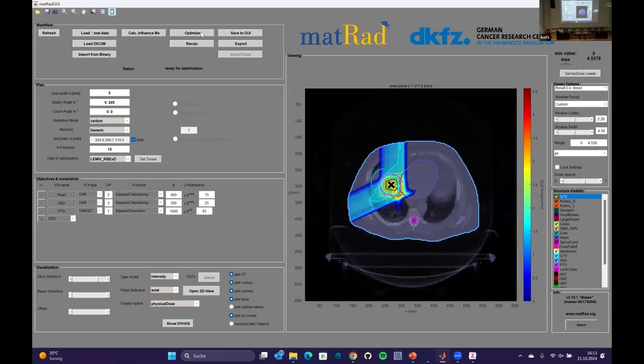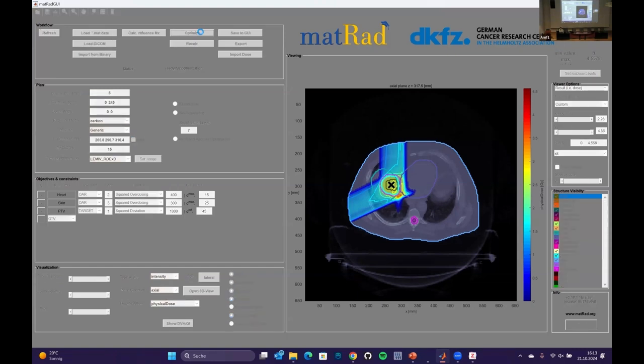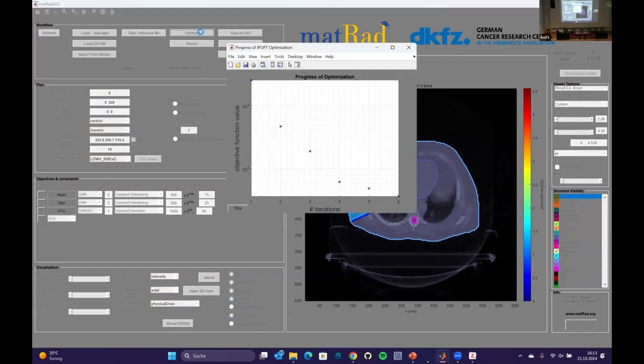And then you click optimize, and we can check out or learn a little bit about the physics and the result of an ion beam. And you see now the optimization becomes also a bit slower. Every step of the way takes a bit longer. There is maybe a question in the chat popping up. Yes, this is also interesting. You see these spikes in the optimization.